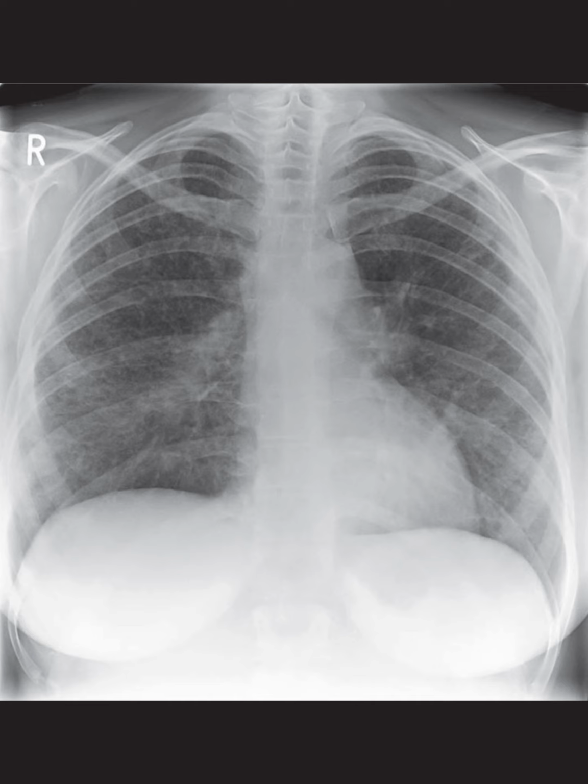Key points to keep in mind. It can be tough to distinguish between lymph nodes and blood vessels on an X-ray. Lymph nodes usually have irregular, bumpy outlines, while arteries are smoother.